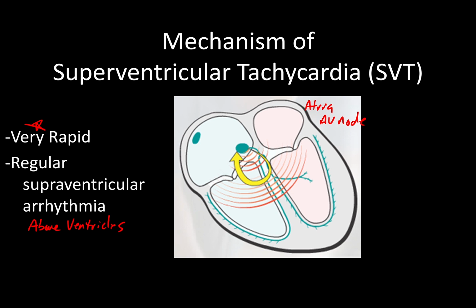That really doesn't tell you a lot though, does it? It just says that, hey, it's above this area, and that's the most I can say. It's not an accurate description, and the reason we use this is because P waves usually aren't visible. That's the big part that helps lead us to this.